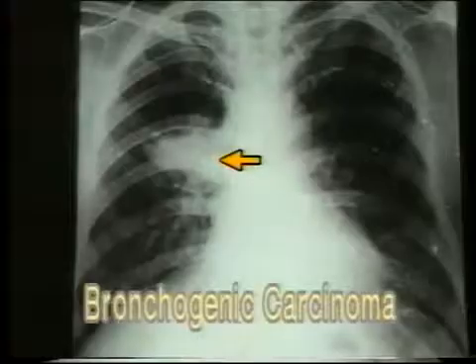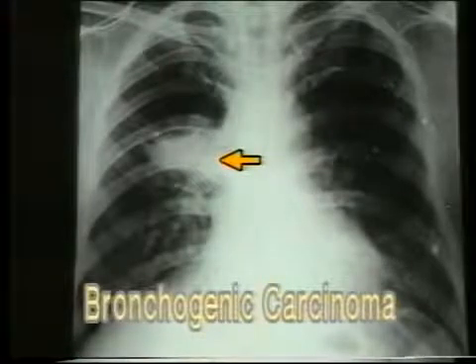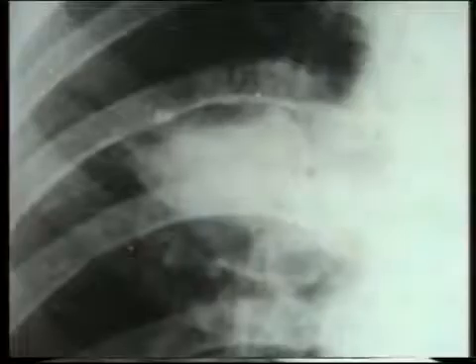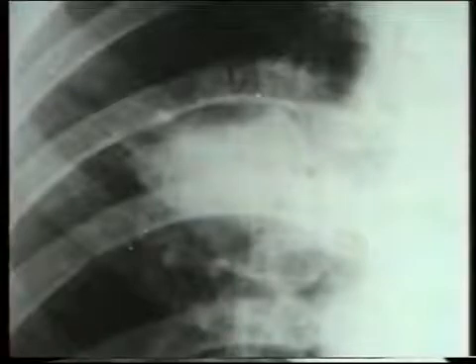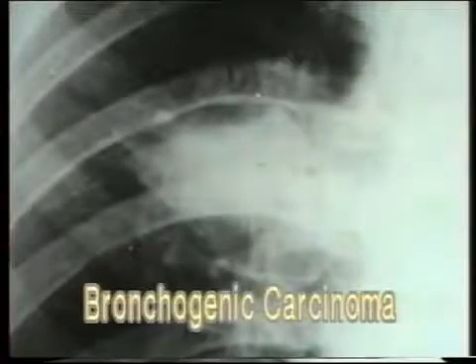This is another X-ray showing a dense homogeneous opacity at the right hilum. It is not related to any particular lung segment and is spreading into the lung tissue. In a close-up view, note its density and note that it does not have a sharp border. It is spreading into the neighboring tissues. This is a typical shadow of bronchogenic carcinoma.